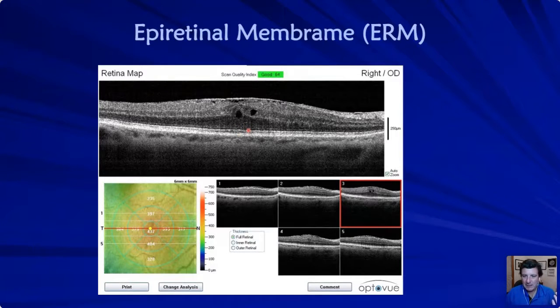And I say Snellen because if you would check it maybe on contrast sensitivity, that would drop way down. The Snellen acuity's got some big steps in there, 20/25, 20/30. But I bet this patient would read 20/20 visual acuity on this.